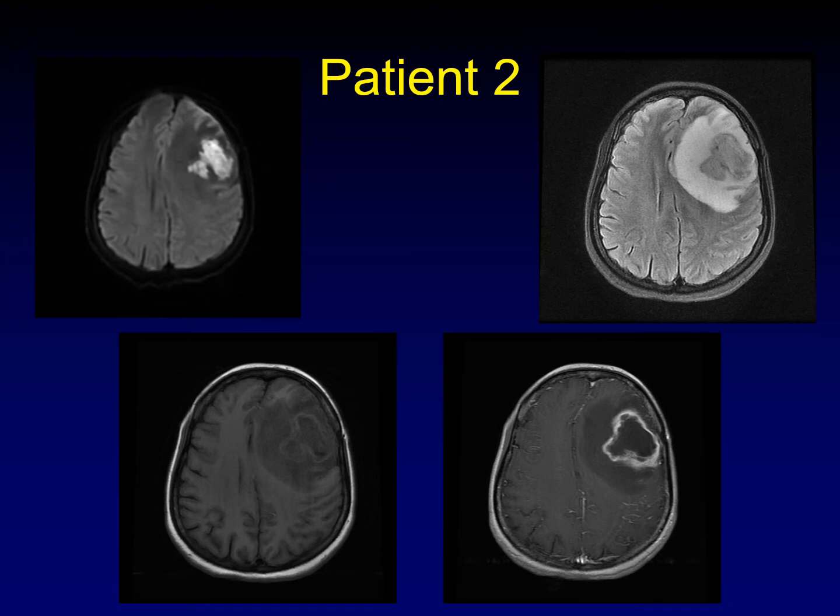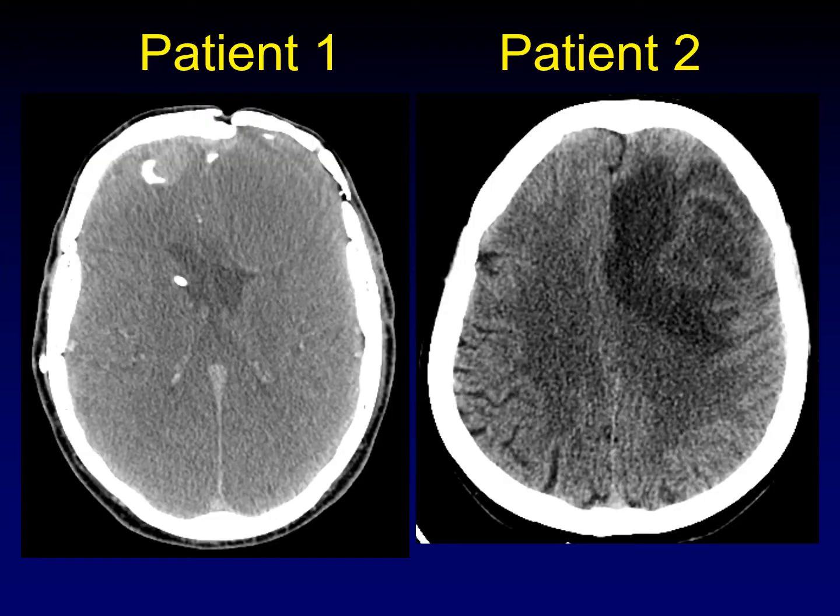this diagnosis is. If you haven't already, pause the video and come to a conclusion about what you think is going on. Let's have a look at these two CTs. These both have large frontal masses, but patient 1 has a very regular rim and there is no surrounding edema. This patient has also had prior surgery here that probably affected the frontal sinuses.